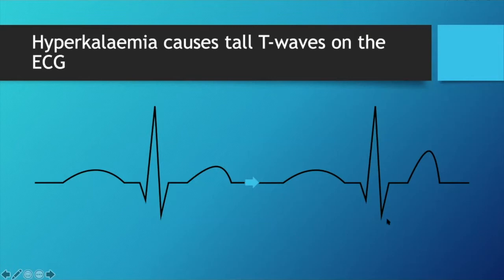So I'm going to use this as my baseline point or my benchmark to try and compare this T wave to the QRS. The idea is I'm trying to create a value or a ratio that is very specific to each baby independently, not compared to a population, but compared to a single baby to itself. Does that make any sense?